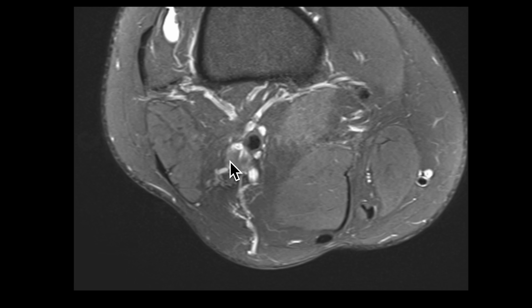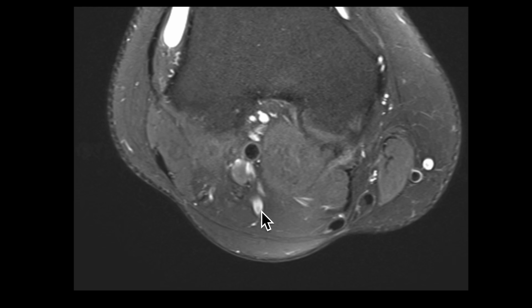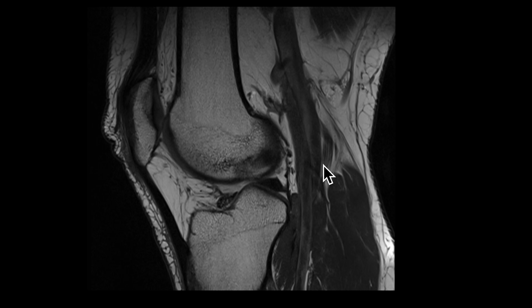But just to show you here, this is the popliteus vein. And here's a short saphenous vein, which is coming from the calf. So this is a short saphenous vein, and it's going to drain into the popliteus vein. There is another structure here, the posterior aspect of the knee, which is in very close proximity to this neurovascular bundle. It has a low signal intensity central component and a bright peripheral component. This is a lymph node, and we can see lymph nodes at the back of the knee. This is a normal finding. If they're abnormally enlarged or they've lost this normal architecture, then we may be able to suggest pathology.